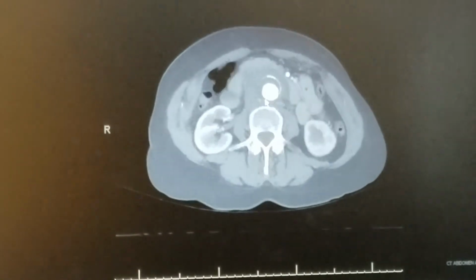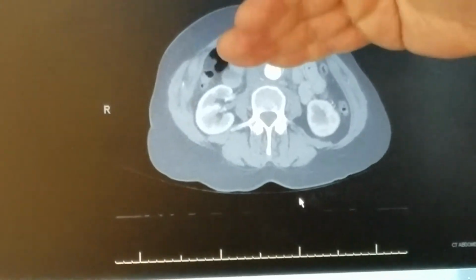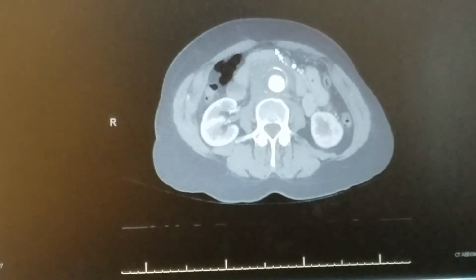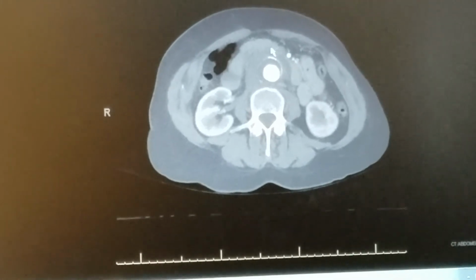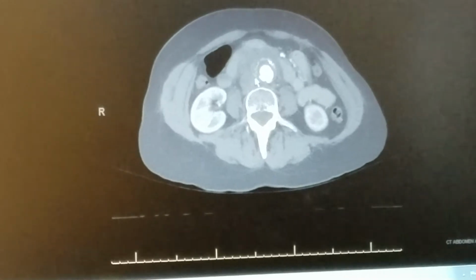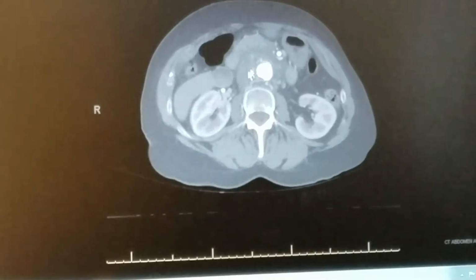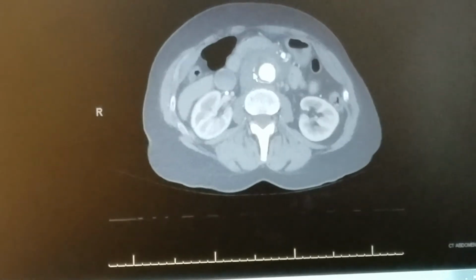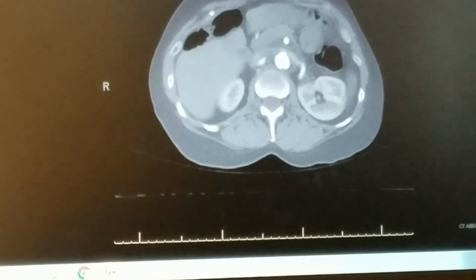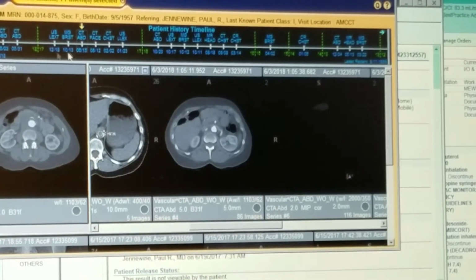So that's what we're talking about, that this is most likely, it's even pushing the bowel and the pancreas up. It's pushing the tissue away, the bowel away. It's even pushing the vena cava away too. But that's what we talked about, that swelling here. And that's highly suspicious for an inflammatory aneurysm. Okay. And so that's what we were working on.